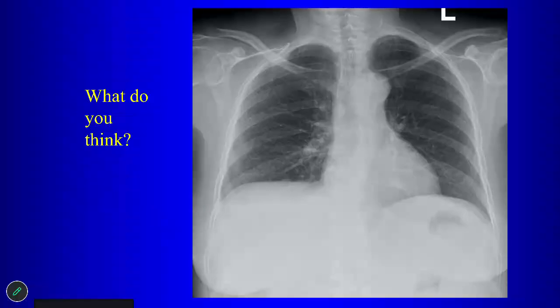So is this diaphragmatic elevation or is this something else? Well, let's see about our position. Our position is actually rather good. You said something about the left diaphragm looking a little more curved. Yes, it does look a bit more curved. The right does look flatter, which could explain it. So what do you suspect might be going on here?